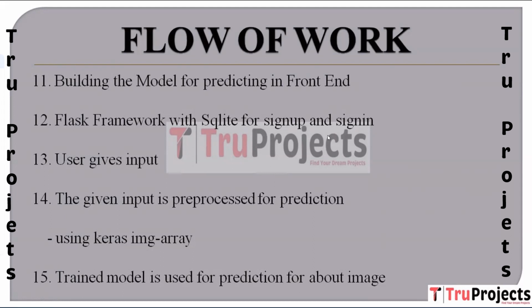Users provide input likely in the form of uploading chest X-ray images for diagnosis. Then we have the given input is pre-processed for prediction. Pre-process the user input images, converting them into a format suitable for input into the trained models.